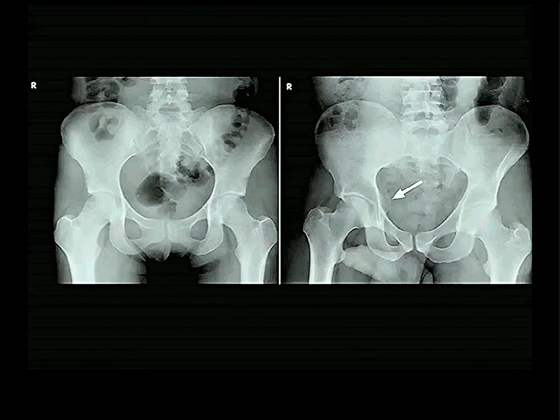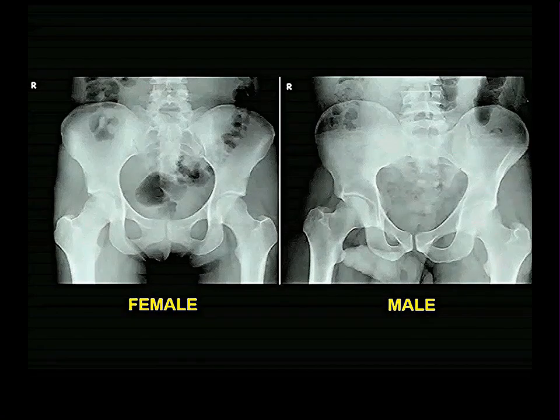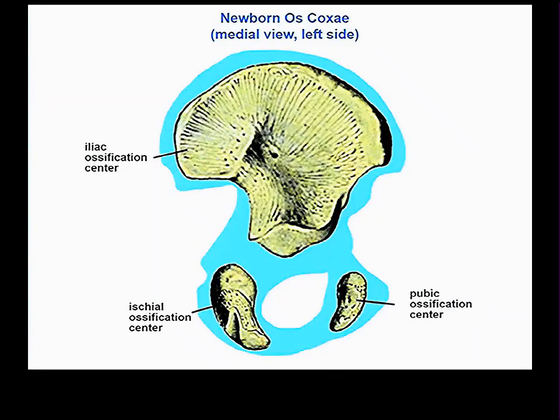And if you look here, you can see the ischial spine of this male, and the left ischial spine of the male here, and they're completely hidden behind the other parts of the pelvic bone in the female because they are farther apart as well. So these are just to alert you to the fact that male and female pelvis are different shaped as a result of the obstetrical requirements in a woman. This just tells you what's what.